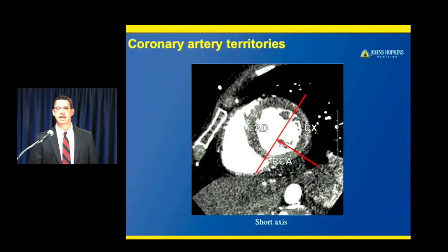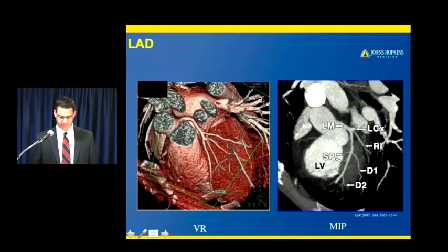Incidentally, this patient had an LAD stenosis. That's why you see that the enhancement of the LAD here is relatively low compared to the enhancement of the myocardium inferiorly supplied by the RCA. So there's relative ischemia here in this patient who was actually having acute symptoms.